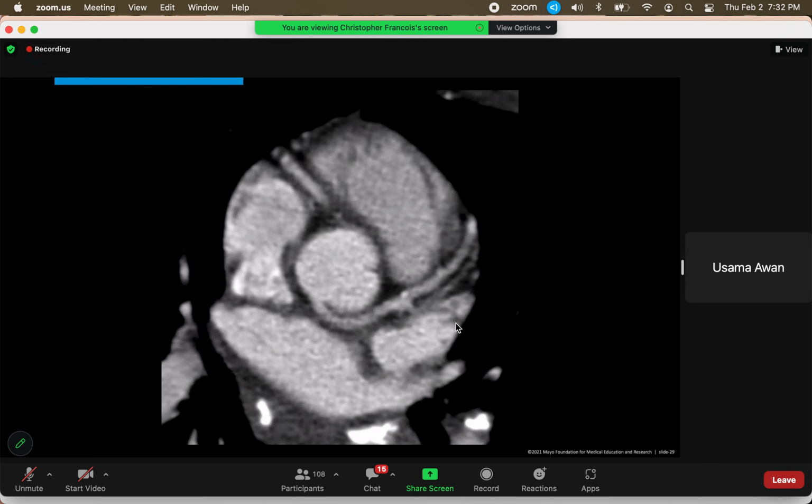Yeah, so it looks like the left main is coming from the non-coronary cusp. Yeah, exactly. So, there's some variation in how people describe the cusps of the aortic root. The right and the left cusps, everybody agrees on. But what should we call this third cusp? A lot of people will frequently call it the non-coronary cusp. But to me, it sounds a little strange to say that you have a coronary artery coming off at the non-coronary cusp. And so I refer to it as the posterior cusp.